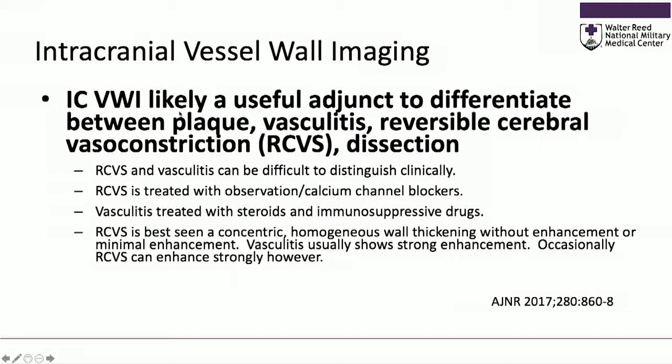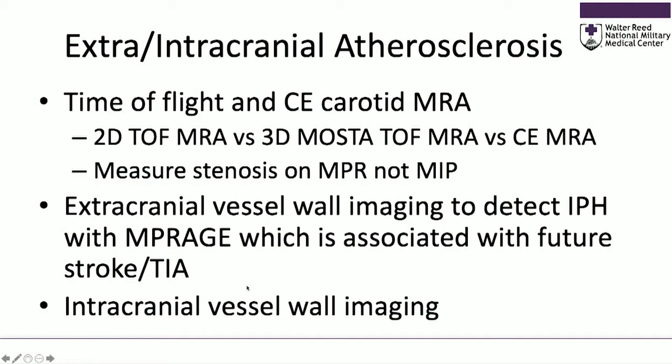So intracranial vessel wall imaging can be helpful in a wide variety of diseases, not just atherosclerosis. So what I've tried to do on John Houston's behalf is go through extracranial, intracranial atherosclerosis, time of flight, contrast MRA, introduce some of the concepts of extracranial vessel wall and intracranial vessel wall imaging that we'll hear more about in the next session. Thank you very much.